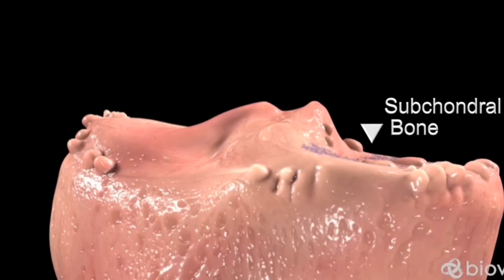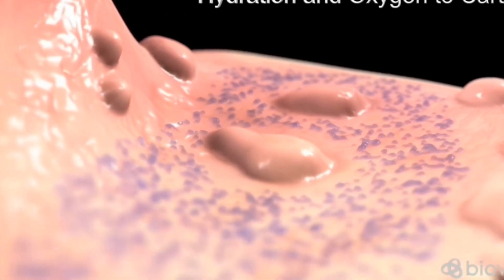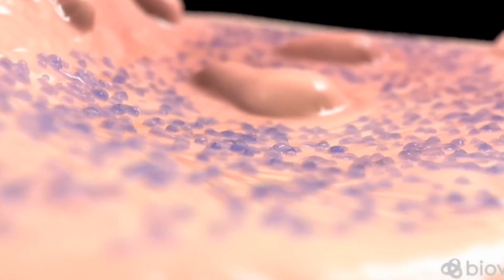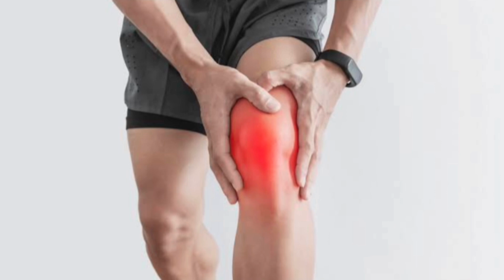Well, in osteoarthritis, as the cartilage erodes, the underlying subchondral bone is subjected to increased stress and mechanical load. As a response, the bone thickens and becomes denser, a process called sclerosis. This is visible on X-rays as areas of increased opacity or whiteness beneath the joint surface. Subchondral sclerosis can contribute to joint stiffness and pain.